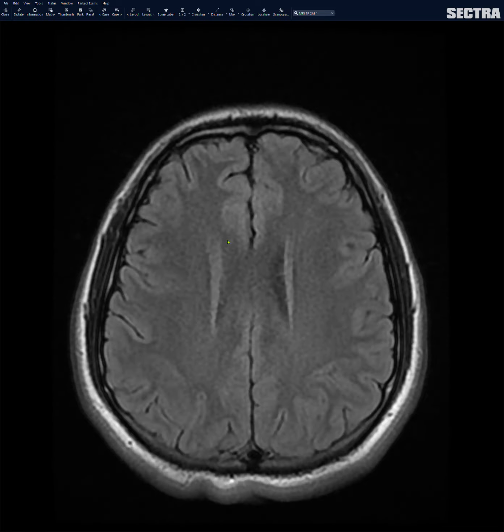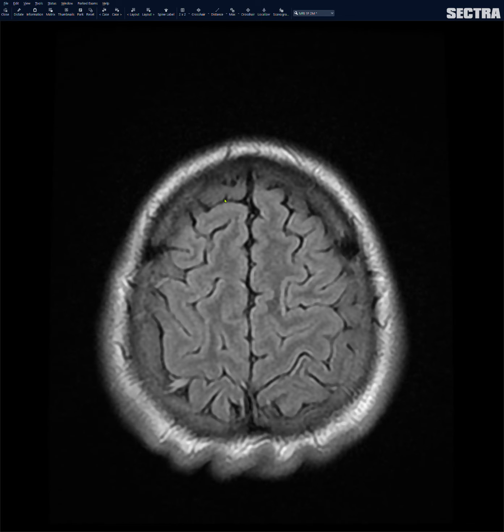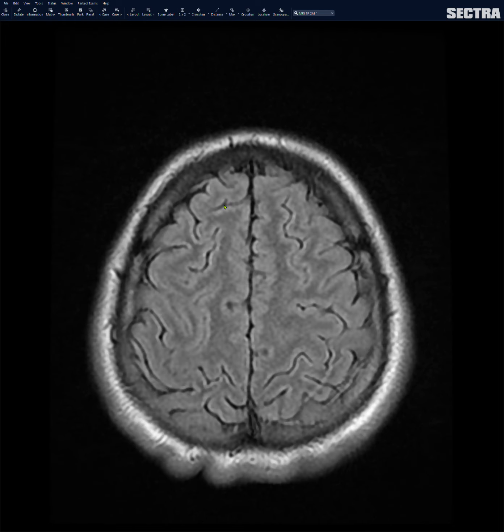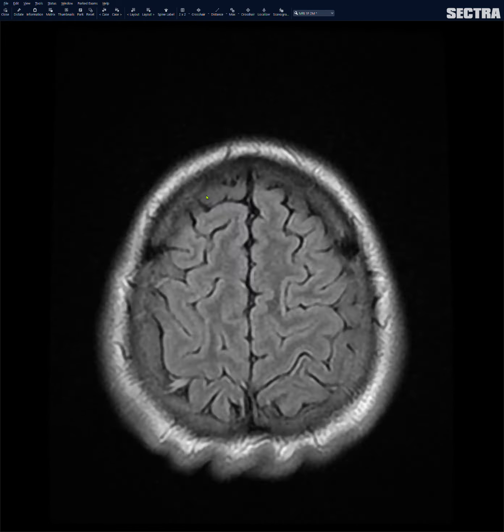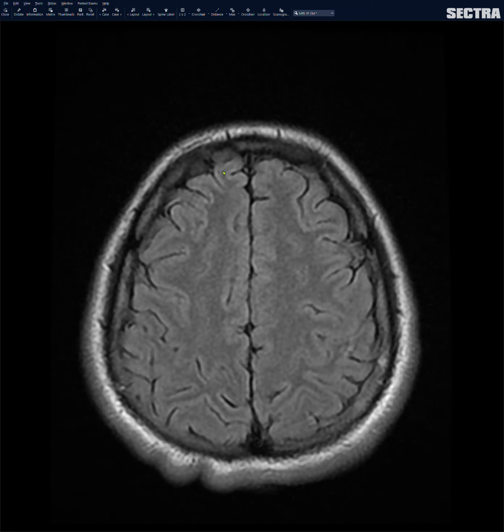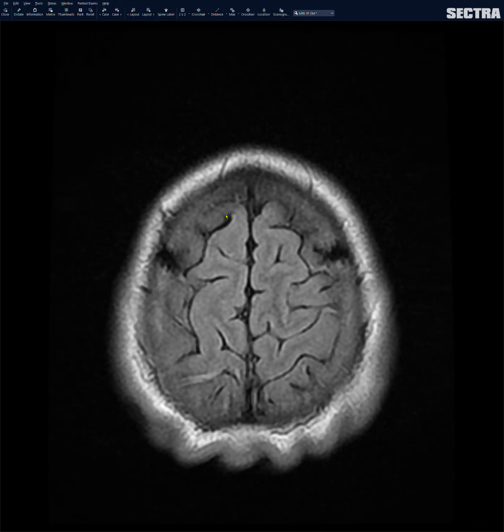Now I want to focus in on the gray matter. I look at the gray matter, the sulci, and the interface between the cortex and the calvarium, looking for any kind of signal abnormality in the gray matter, like a mass or something like that, looking for any kind of hyperintensity within the sulci, which could be subarachnoid hemorrhage or it could be artifact, among other things. And you can also catch a subdural pretty well on a T2 FLAIR. Usually they're bright, they're located between the cortex and the inner table of the calvarium.